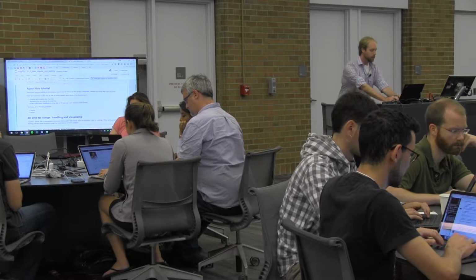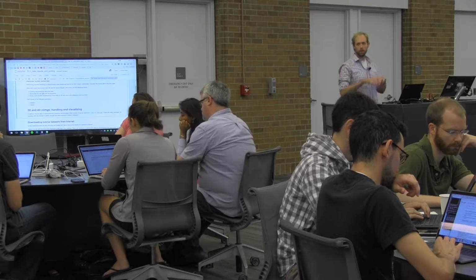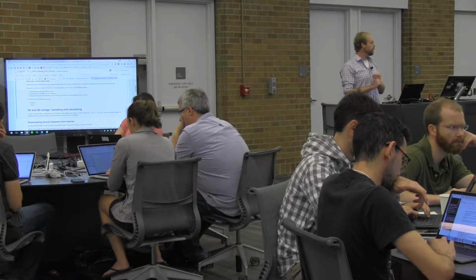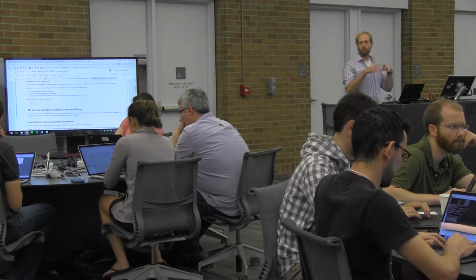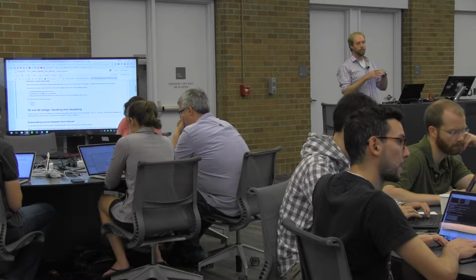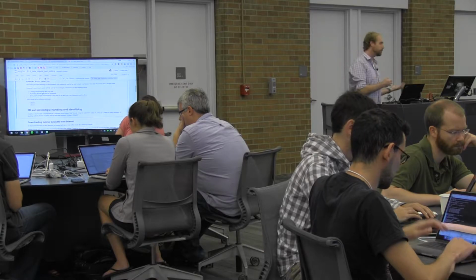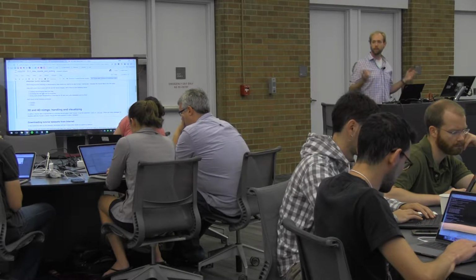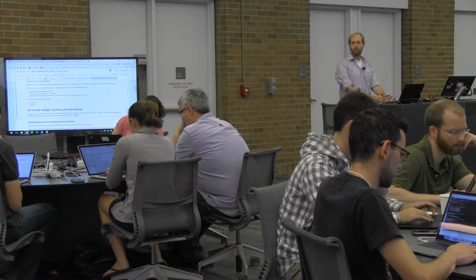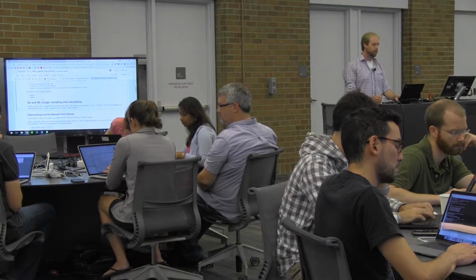Okay. So the first thing that I want to do is talk about 2 really big packages in the world of neuroimaging. The first one is called NiBabel, and this is in some ways the centerpiece of the neuroimaging stack in Python. The idea about NiBabel is that neuroimaging data can come in many different shapes and sizes. Some of it's volume data, some of it's surface data, some of it's diffusion information, some of it's statistical maps. But what we want is one package that can handle all of these things relatively flexibly, and that's what NiBabel is designed to do.